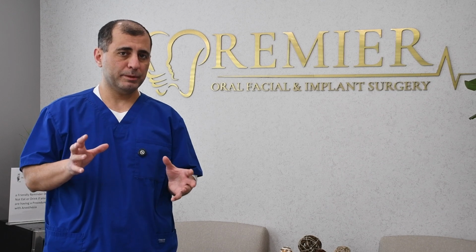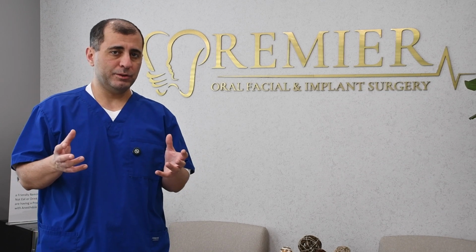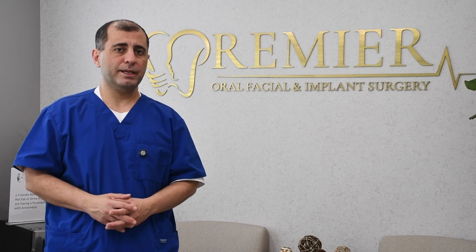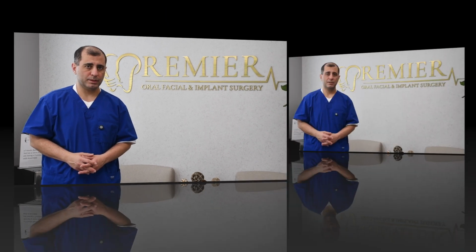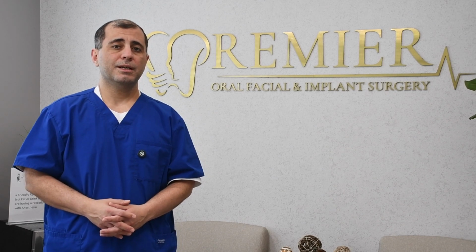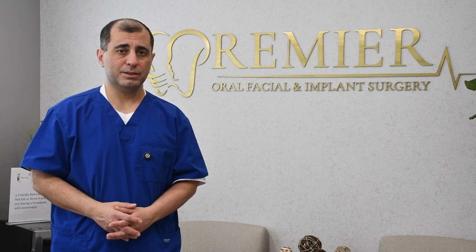Today I am going to explain to you what a dental implant is and what the dental implant process is, in a nutshell, without diving into too many details, just for you to understand how dental implants work. I'm going to be using a three-dimensional model that I generally use when I show my patients what dental implants are and how the process goes, just to help them understand the process.